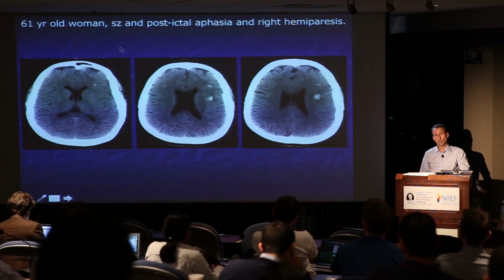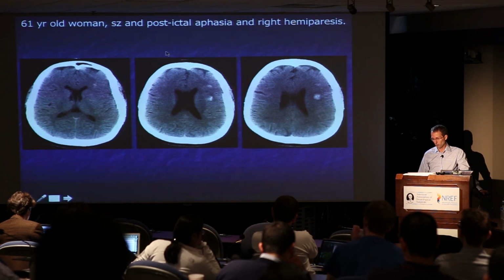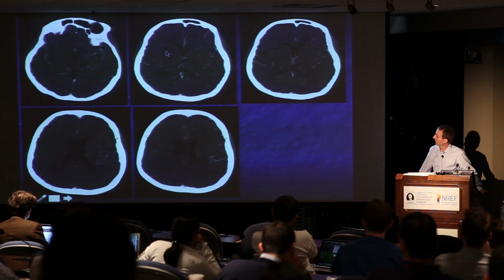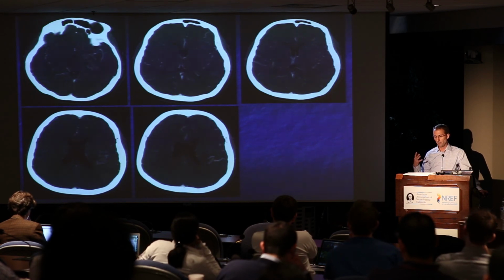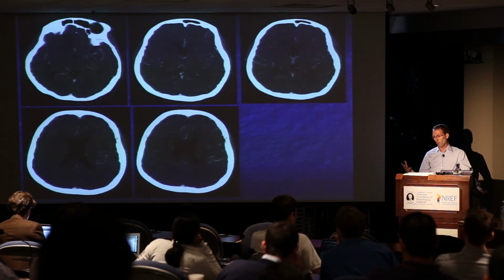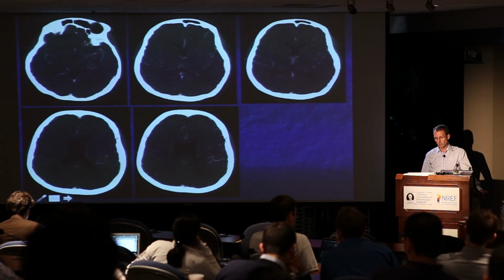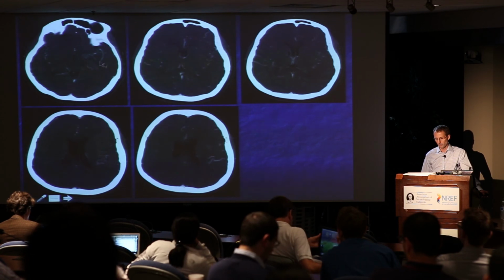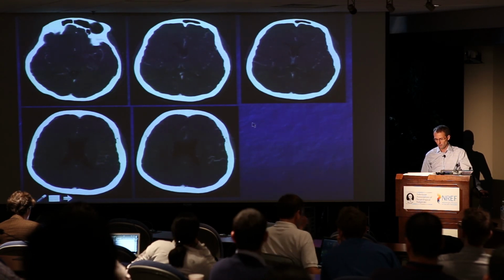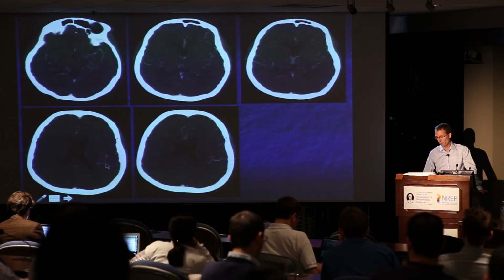There was an MRI scan that also showed edema in this area and in the temporal lobe. And on the CT angiogram, I don't know how well this projects, there's no aneurysm, there's no obvious abnormal external branches, there's no obvious abnormal internal branches, and yet there's a bunch of corkscrewish, tortuous vessels everywhere you look.